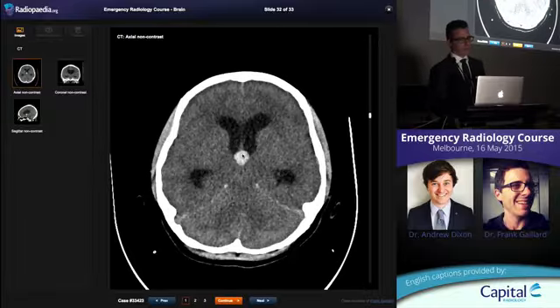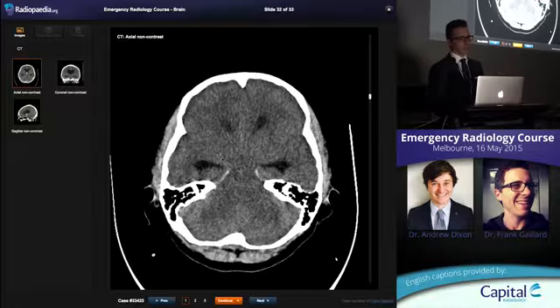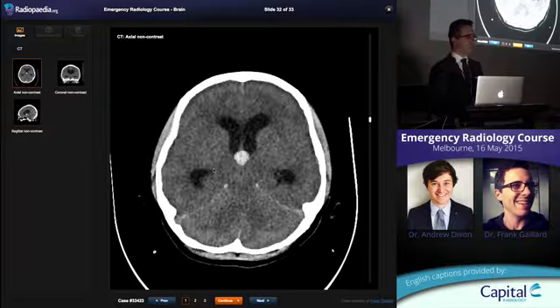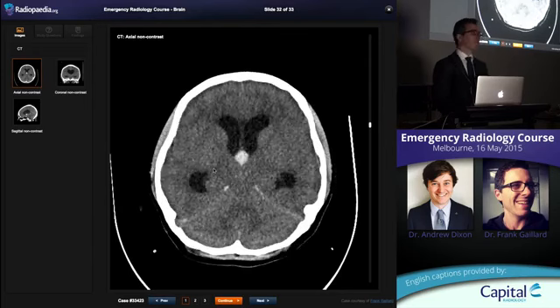This is located at the foramen of Monro, and it's a hyperdense, very rounded structure. This is the typical appearance of a colloid cyst. It's a little lesion that you might not have heard of before. It's not terribly uncommon. Most of them are a few millimetres in size and don't do anything except worry you once you see it. Occasionally they obstruct the ventricles and probably also obstruct the draining veins. And you get acute hydrocephalus and you drop dead. So any colloid cyst over 5, 6, 7, 8 millimetres, depends on the surgeon, depends on the patient, depends on how you feel on that day, needs to be considered for surgery.